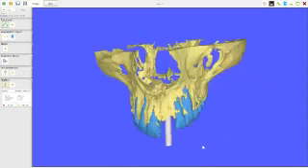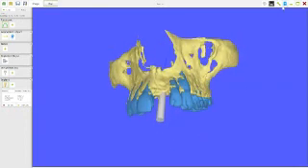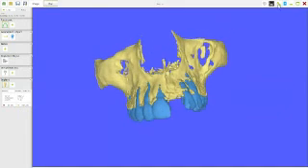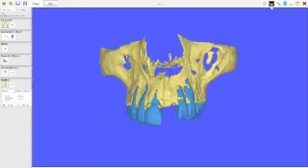And we're happier with that. And I can take the extension off, just left click, hide the extension. And if I look at that, I can see that's quite buried. I can't see the implant coming out of there anywhere. That's good. Go back to 0, going to that one, zeros it all again. Put my extension back on. The extension is very useful for looking at how things line up and all the rest of it. So I'm going to put the extension back on.